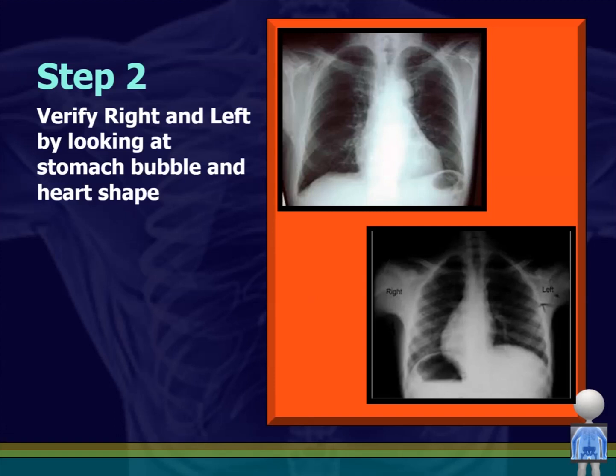Sometimes you'll see on the top of a film, and I'll show you when we get to some other ones, a little L up here. Those are also good reminders of, do you have the film on the light board right? The other way to do it, if you're talking about a real film, somewhere down here will have the patient's name, and it'll have a name plate in the picture. If the name is backwards, you are backwards, okay?